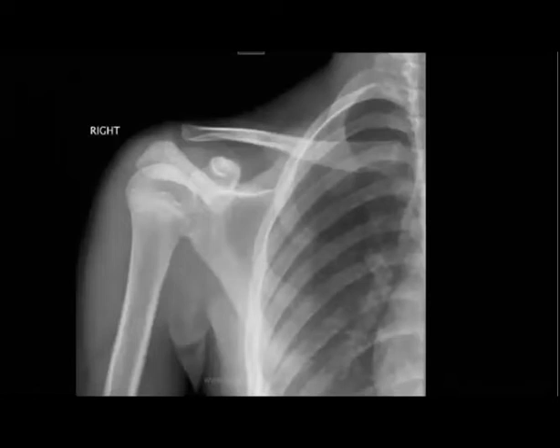What do you think about this? Upper limb. So in the rapid reporting exam, again, you have 30 cases, half of them at least, or maybe less than half, are normal. But you should be used to checking for the abnormality.